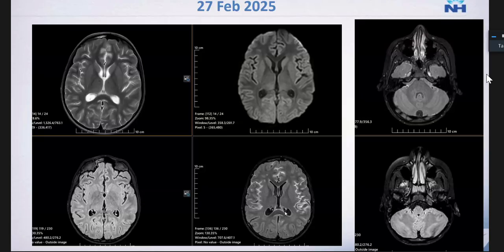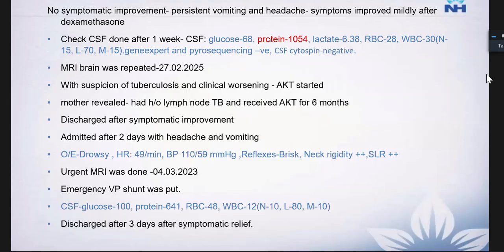So now in this case, I can see that most of you are saying initially there's a meningitis, which could be secondary to pyogenic or TB or viral or fungal. Okay, so those thoughts are valid. Somebody has mentioned lymphoma. Lymphoma we could not have thought of directly at this presentation because we don't have clear-cut evidence of any markedly mass-like thing. So we also thought that this looked more like a meningitis kind of appearance, which could be secondary to infection.